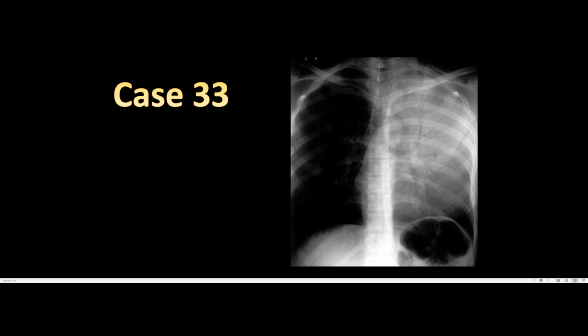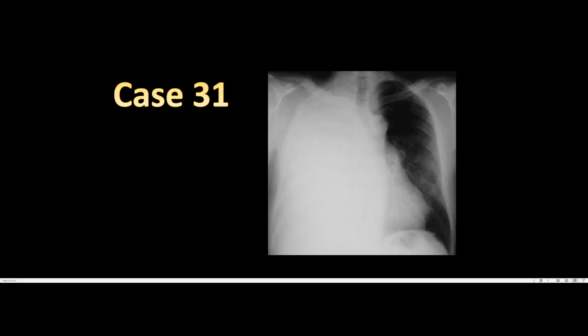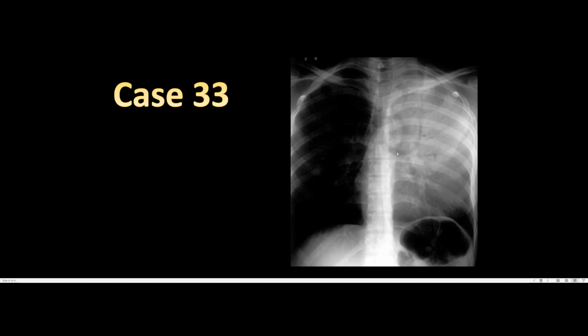The second issue with this imaging is the abnormality at hand. We can see here there is a large left-sided opaque hemithorax, all right? And this large left-sided opaque hemithorax also shows air bronchogram, which further supports pneumonia. This is also another differential diagnosis between pleural effusion and pneumonia. This is a good one as well, if you have the presence of air bronchogram. So if you have air bronchogram with contralateral shifting of the mediastinum on a left-sided opaque hemithorax, you think of pneumonia as well. But again, you add that with the over-penetration, because of visibility of the lumbar spine way too much, you can't trust the finding as much as you want to, all right? You'd order another chest X-ray.